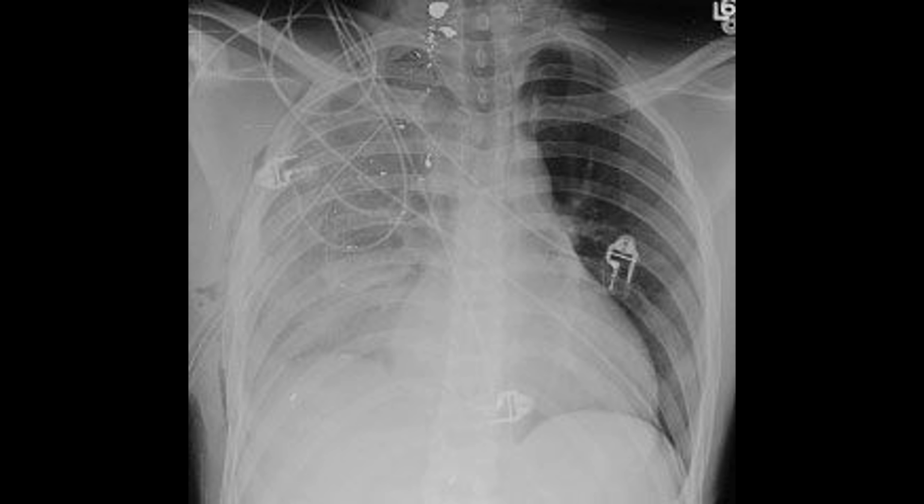The radiographic appearance can sometimes be confusing because the increased density of the pleural blood reduces the overall lucency of the pneumothorax. When the patient is supine, the fluid layers dependently at the apex and the gas rises to the base, accounting for the appearance seen on this film.